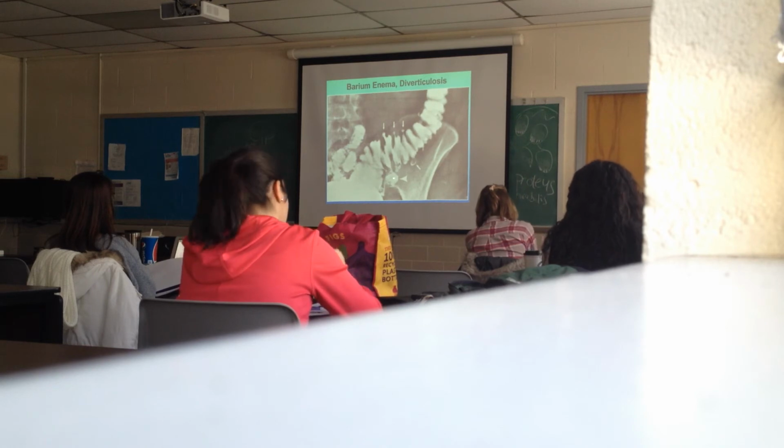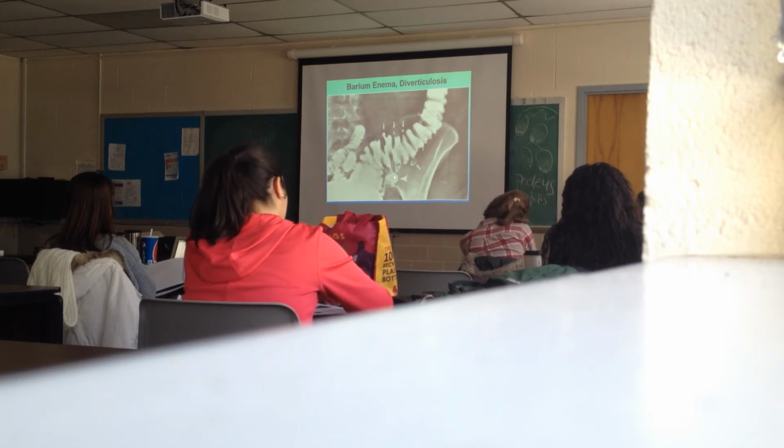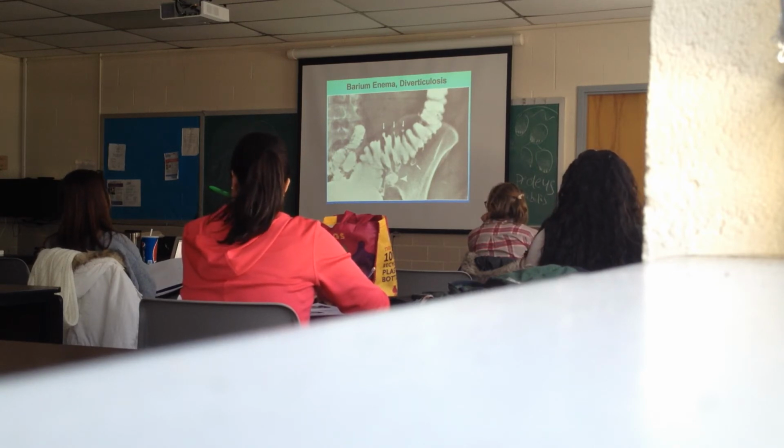This right here, what is that? That's an abscess. It's actually what's happened here. You have a diverticulum, probably much like that, that ruptured, the contents of the bowel spilled out into the pericolic fat, and an abscess resulted.